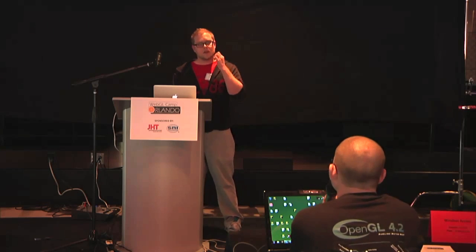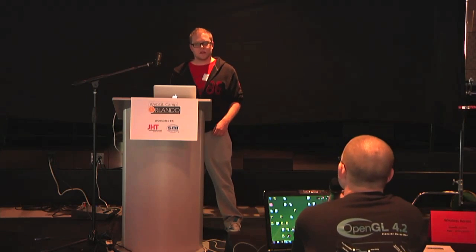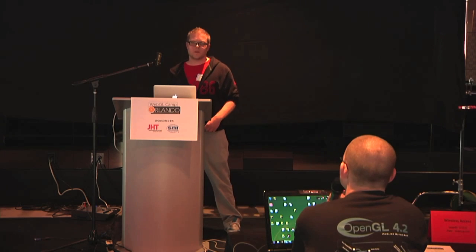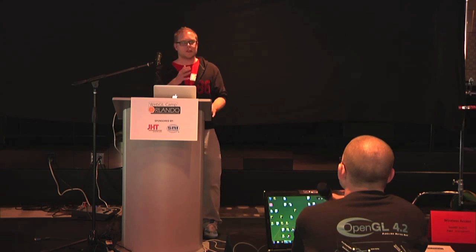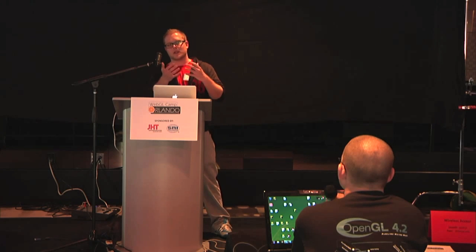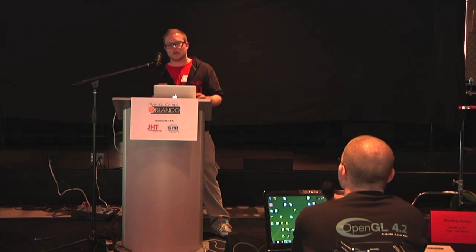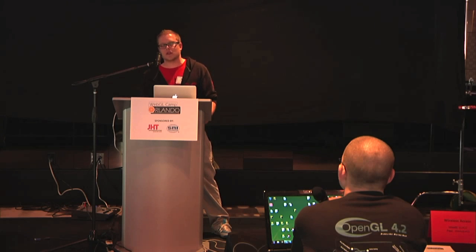I have two quick questions. One was, you mentioned sometimes you have up to 100 megabytes of data you have to transfer. What is the original size of the voxel grid? Like when they do the scan, what resolution is that at? Maybe one by one. So it's 256 by 256 by 160. So the 1 by 1 by 1 is the voxel size, and then for a brain it would be 256 by 256 by 160.